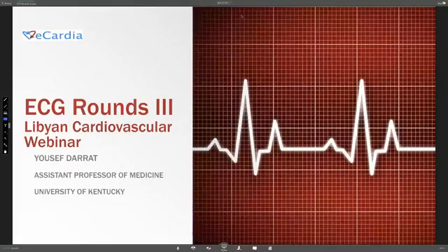Assalamu alaikum. Thanks for joining us today. We hope that this will be a very beneficial educational experience for everyone. Our main focus, of course, will be ECGs, and so we'll present some ECGs, give you some time to look over the EKGs, and then provide you with options. Please type in your choice in the comment box on Facebook, and then we'll go over the answers.